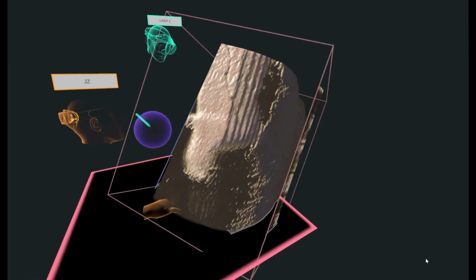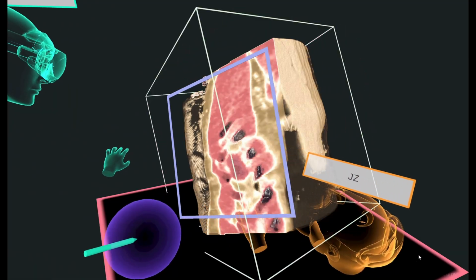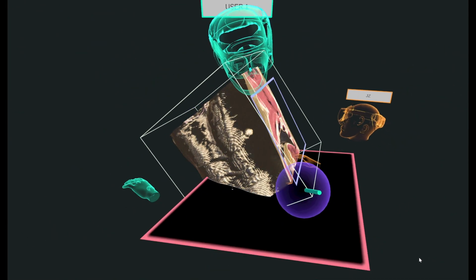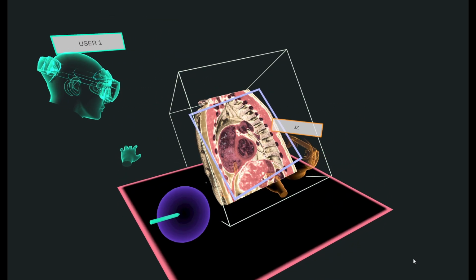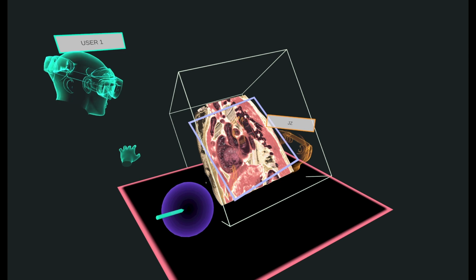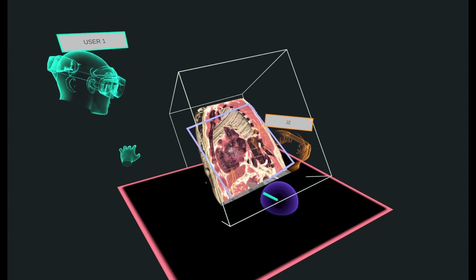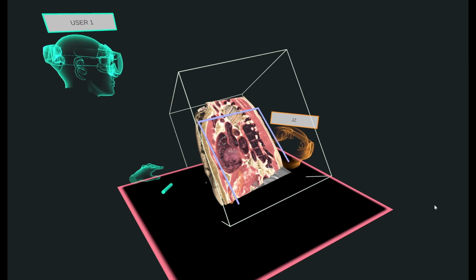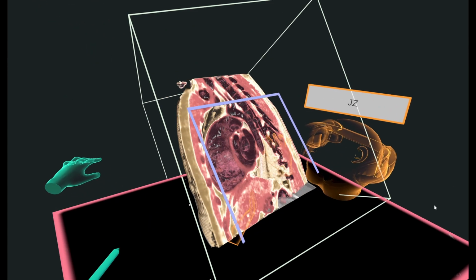I like to see this from the left atrial side. So we're going to rotate the model, so we can do that. We're going here into the left atrium. You can see that's the aorta. And as we keep going, we can see the anomalous veins. So these are the veins, and those are the anomalous ones back there coming into the SVC.